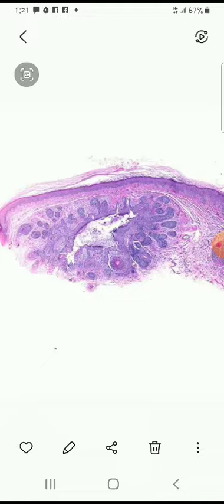So what we see is a cystic cavity inside the dermis, surrounded by some follicles which are connected to the central cystic cavity, or the follicular cystic cavity. So it is also known as the mother follicle and the baby follicles, which is very typical for trichofolliculoma.